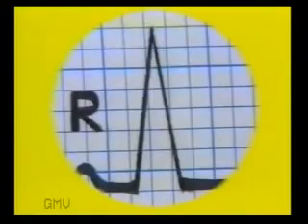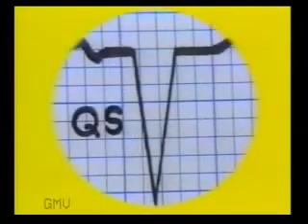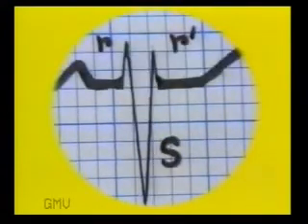This is a R pattern with no Q wave, no S wave. In this complex we see a small Q wave, a tall R wave and a small S wave, a QRS complex. And in this complex there is only a downward deflection, no R wave. We do not know whether it is a Q wave or a S wave, so it is termed as QS complex. This is a RSR dash with a deep S wave.